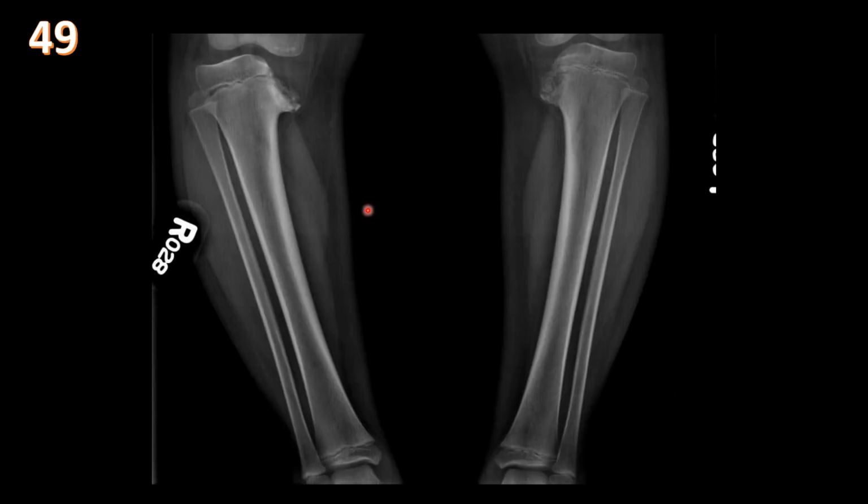Case 49, we have bilateral views of the legs, and we see that there is a disturbance and destruction and irregularity at the medial proximal tibial growth plates, and it's bilateral. And this is consistent with Blount's disease, which is an osteochondrosis of this local part of the proximal tibial growth plate. So it's a growth disturbance, and it's one of the eponymous osteochondroses. So you see one, you see them all. Remember, Blount's is also known as tibia vara.